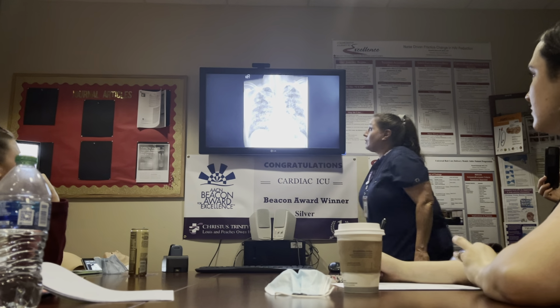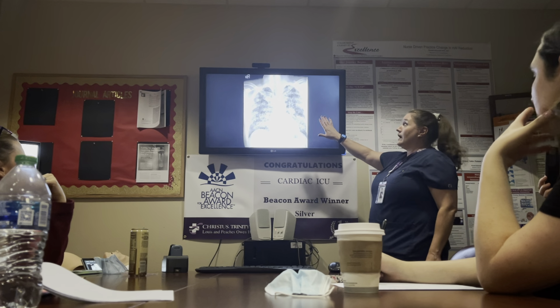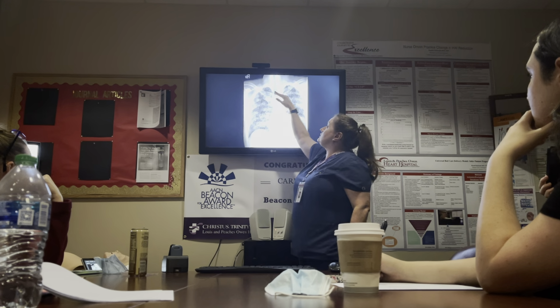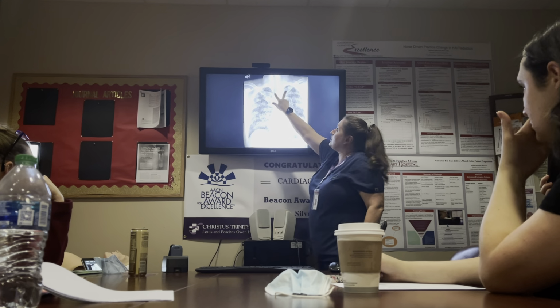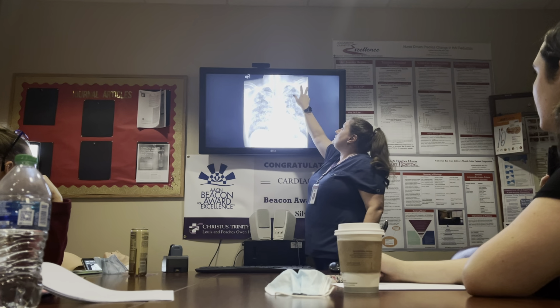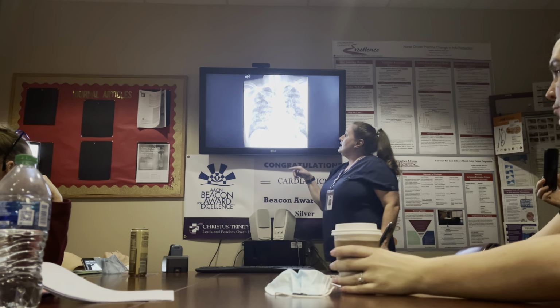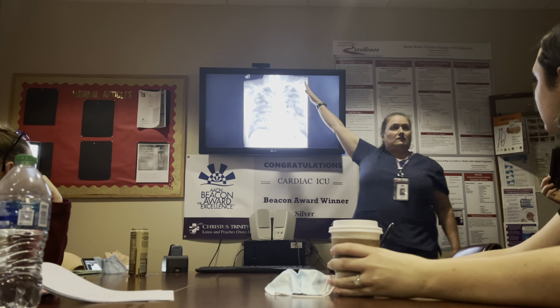Okay, so this is a reasonably good film. You can see a lot with it. You don't see any real narrowing of the trachea. It comes down to both sides. It's mid-position. There might be a little bit of lordosis where they're kind of curving over a little bit here because their collarbones are down and not as high as they usually are. You don't really get much of their humeral heads. Their scapula here, they've a little bit lighter there. You've got a gastric bubble underneath the diaphragm, but it's kind of diffusely hazy, would you agree?